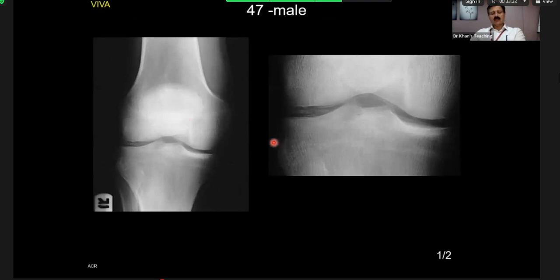Spot diagnosis, what is it? Ochronosis? Ochronosis. Intervertebral disc calcification, which has a differential. Intervertebral disc, or do you mean the cartilage? Yes, it is cartilage. The ossification is at the place of the intervertebral disc, but basically it is the hyaline cartilage. So the differential diagnosis does include alkaptonuria. This is a knee joint, and in the knee joint, alkaptonuria you can definitely keep.